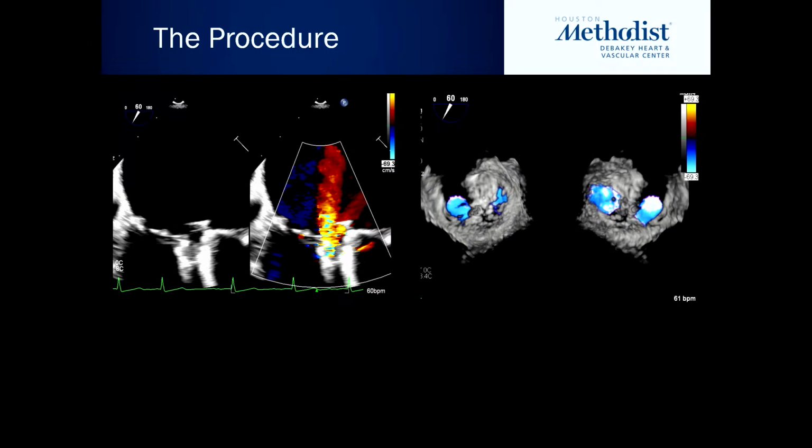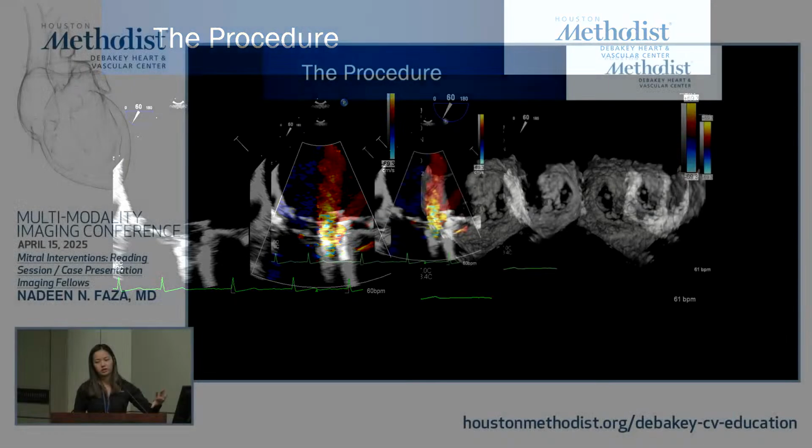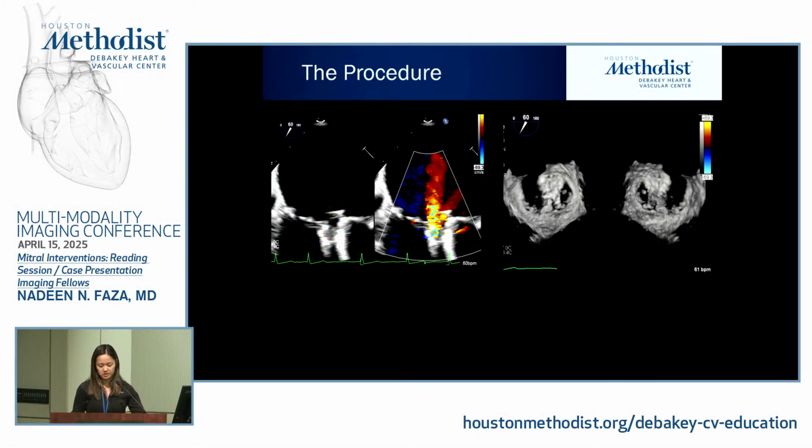Yeah, so like I mentioned in the pre-procedure process, everything we did, we actually redo it during the procedure, every single step. That includes the first clip, while the clip is not released, we do the gradient, everything. And then we release it, check it again, and then we do it again for the second clip. I just kind of shortened it, making sure that there are not so many steps involved.